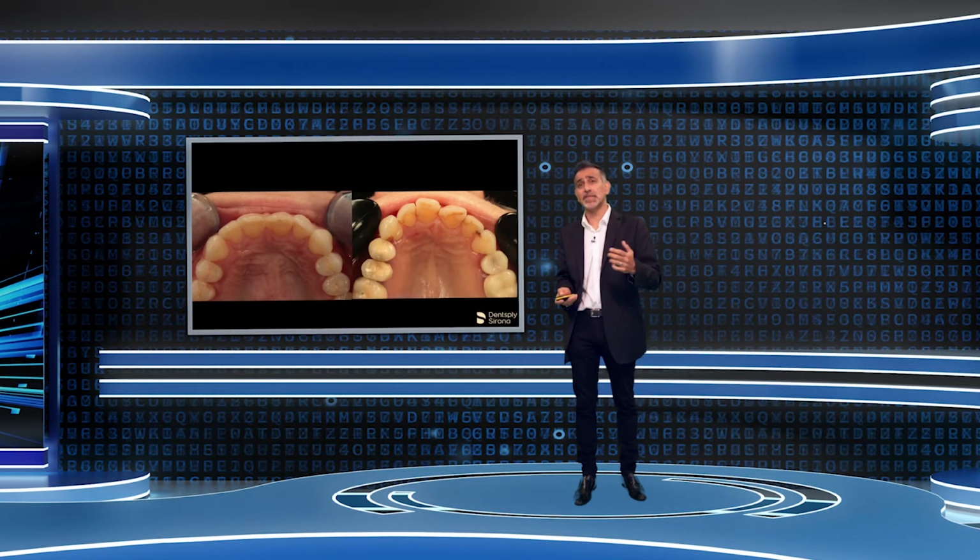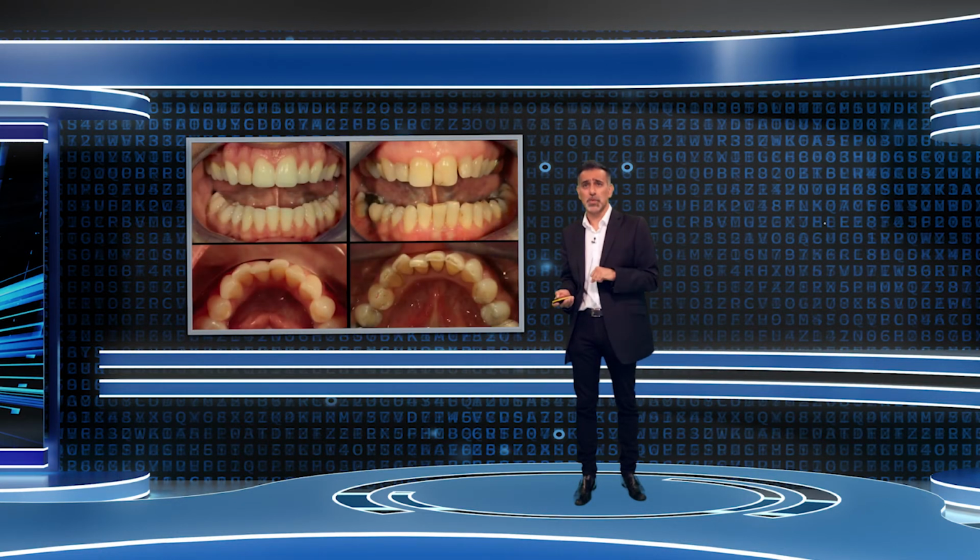Again, here's the occlusal view of the daughter, here's the occlusal view of the mother. And you can see it really does tell a story of where things are likely to go with the daughter. So what we should do, and later on through the presentation, I'm going to show you what I did with SureSmile Aligners for the daughter.